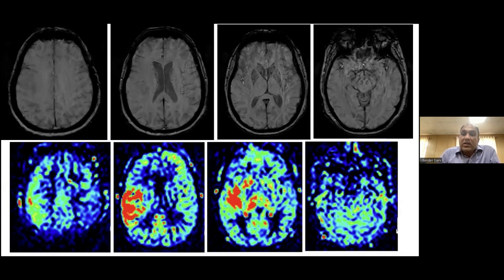Autoimmune encephalitis is another condition in which you can see similar vague signal changes involving the hippocampus, thalamus, basal ganglia, and cortex, which can involve both hemispheres and may not be in continuity. They can also have seizure presentation, with subclinical interictal activity.